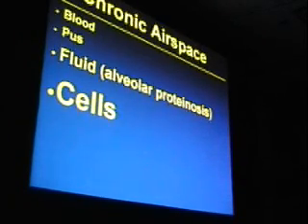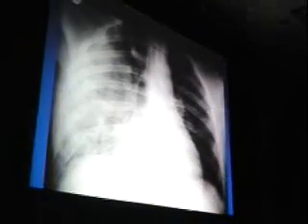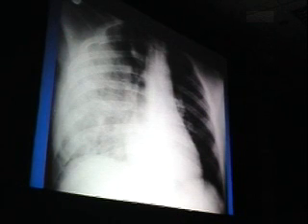On the other hand, if the patient's presenting with insidious symptoms, they've got slowly progressive abnormalities on the radiograph, or even non-progressive abnormalities over a number of months, we're not going to think so much about hemorrhage and maybe some chronic infections, but not much. We may think about alveolar proteinosis in case of fluid within the air spaces, but then we're going to be shifting primarily toward that other cellular sort of catch-all area of the differential diagnosis. So to illustrate, let me take this case. When I observed the case, I observed there's a fairly homogeneous opacity within the right lung.